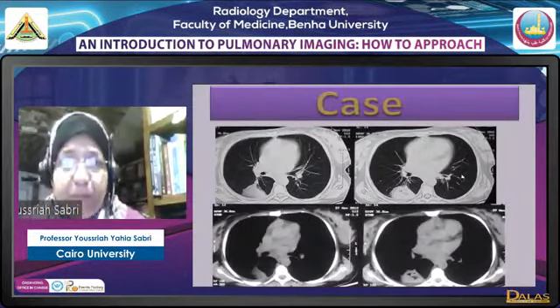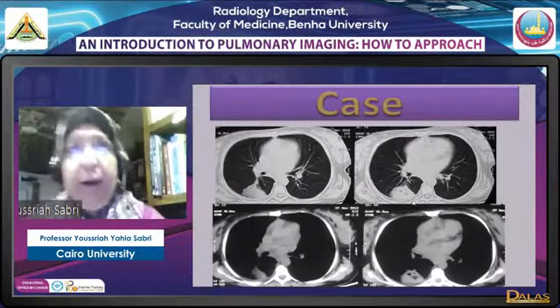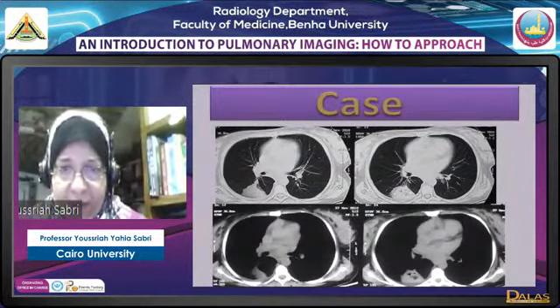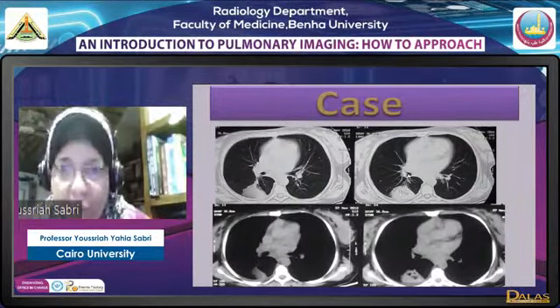Okay, here we have another peripheral lesion, but this peripheral lesion has many characteristics that should be known by heart. Number one, this peripheral lesion may be a mass or a nodule. Here we have a mass. Subjacent to it, there is pleural thickening, and medial to it, joining it to the hilum, there are crowded markings.